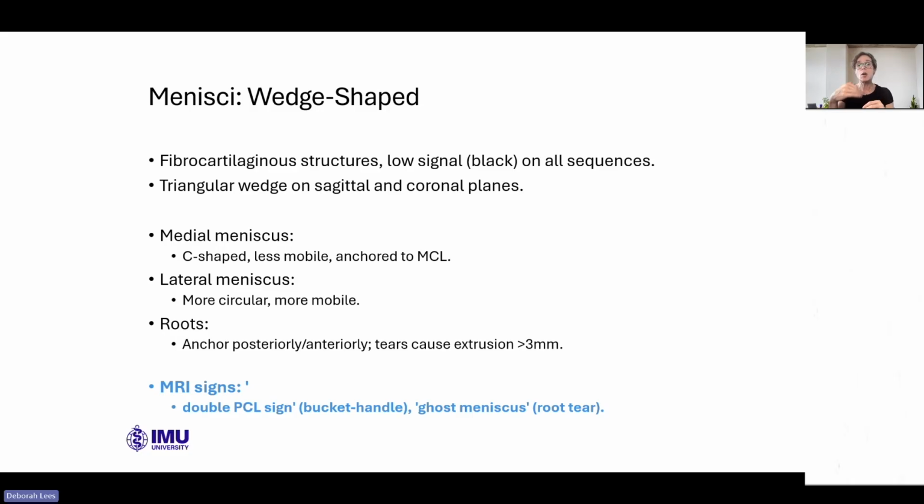So if we've got a horn injury or a root avulsion, it's a very, very significant injury. It often needs surgery, and even with surgery, the ongoing consequences for that can be pretty devastating. It's not something that we really used to recognize much 15, 20 years ago, but with the advent of imaging and a better understanding of the knee and the mechanics, we're now starting to recognize these femoral meniscotibial ligament injuries, the separation injuries, and then these avulsions and these root extrusions.